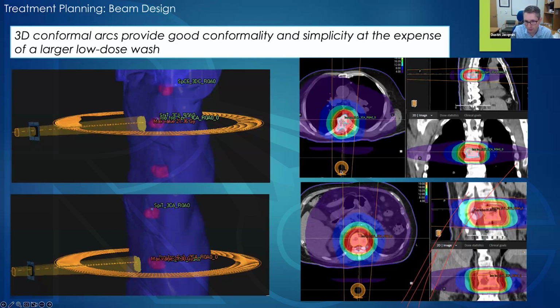And then where the orange is kind of tapered back toward the edge of the circle, that tells you the dose rate is going down. So this shape kind of tells you that the dose rate is uniform, except kind of at the back and a little bit from the side. And so, this treatment planning system lets you optimize a little bit on dose rate. The MLC positions are fixed. It's still a conformal arc, but the dose rate is modulated to help make the dose more uniform. And these are relatively quick to deliver. Once they're set up, you just do a single arc and it's done.